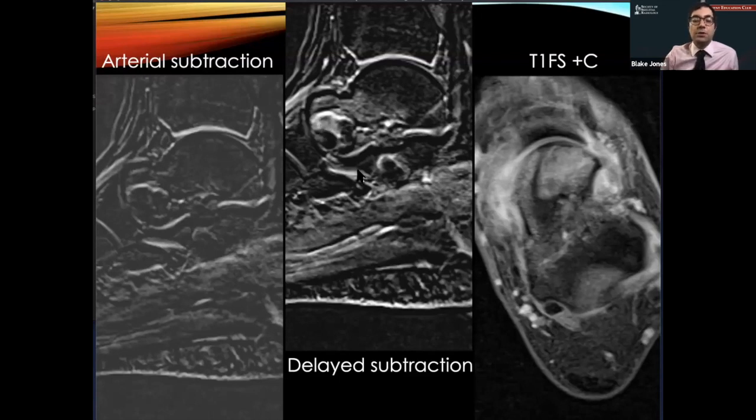You should not have a blob of enhancement in an ABC. You can have peripheral and lobular septal type enhancement in an ABC, around the little locules, but a two-dimensional or three-dimensional blob of enhancement shouldn't be something you're seeing with a pure ABC.